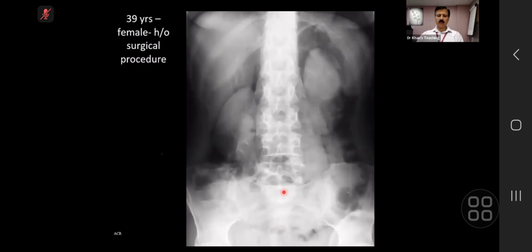Excellent. And it should be in the deep pelvis, outlining the rectum as a part of the rectum, which is retroperitoneal. Outline will be very difficult to see. The lesser sac you can see, but obviously on plain film it's difficult to pick up. Is the lesser sac by definition retroperitoneum? You remember the lesser sac has a connection with the peritoneal cavity, so that's peritoneal.